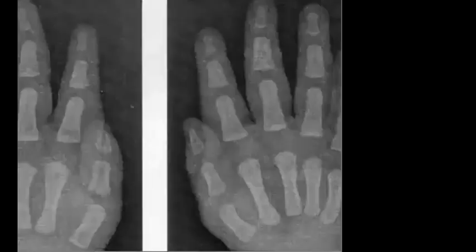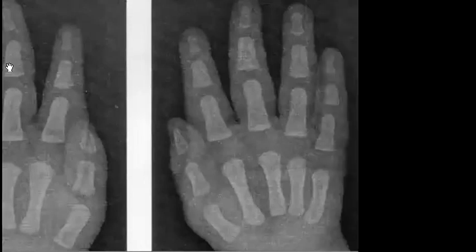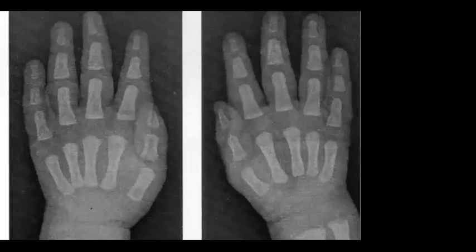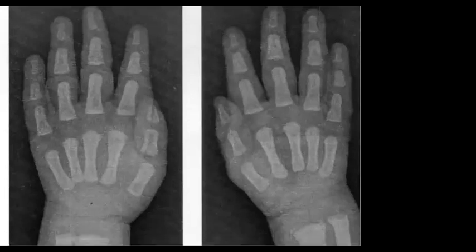So again and again, you check for all the bones, which is called skeletal survey. So you will go to do a radiographic skeletal survey, and now they also include CT brain to check for any accidental, non-accidental injury. Okay.